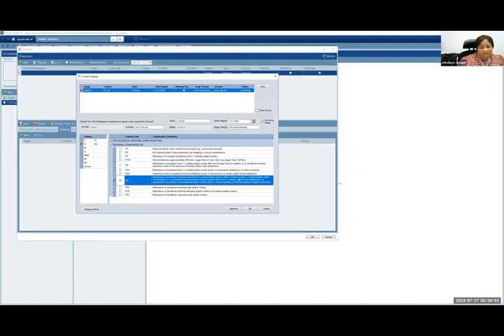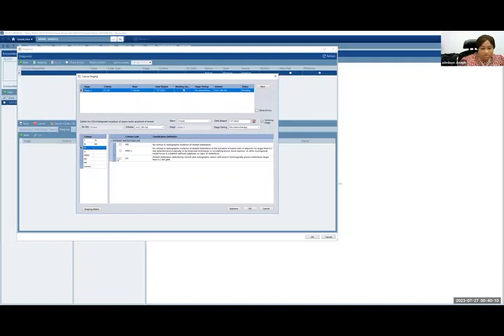So the question someone asked me was, how will you see infraclavicular or internal mammary lymph node involvement? That will usually come up on a PET CT, is where you will usually find it. You will not be able to tell that there's internal mammary lymph node involvement on just physical examination. So metastasis, based on imaging of this woman, there is no evidence of distant metastasis. So we're going to select an M0 at this time. And then the grade, we are saying she's a grade 2, HER2 positive, or she's HER2 equivocal, we don't know. She's ER positive, she's PR positive, or she's PR negative, ER negative.